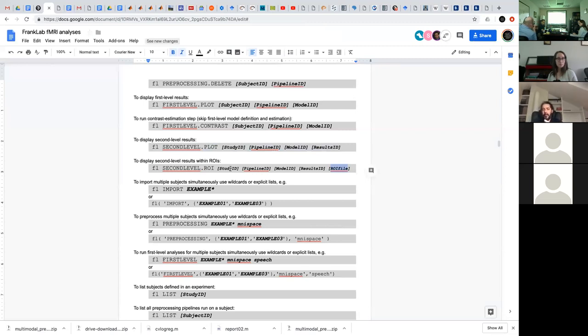In practice, if you define an ROI with your structural data, the raw data of your subject before any transformation, and you manually outline the region that you care about, and you want to use that ROI for second level analysis, you would still have to transform that to MNI space, right? The way you would do that typically is to apply the same transformation. So you take these y underscore something files that SPM created in the process of normalization, which encode the transformation that SPM found to best match the original structural file to MNI space, and apply that same transformation to your ROI file.